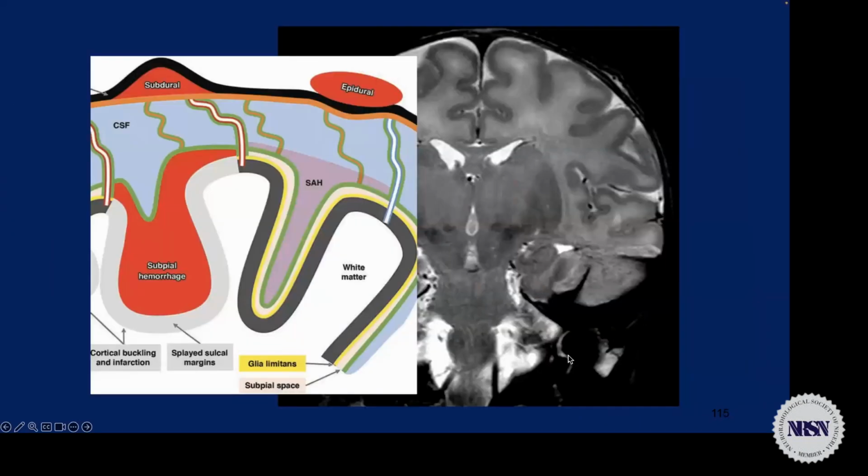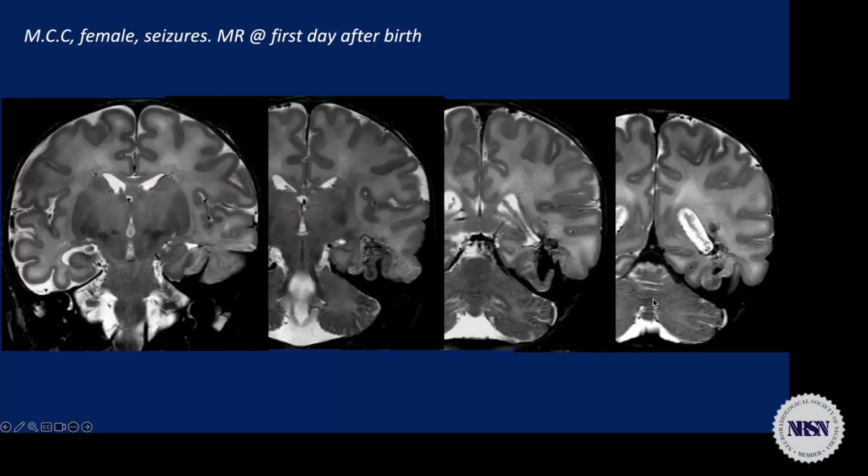And you can see here one case. This is just blood within the subpial space. And what is important is that this blood is also present together with the cortical lesion. So where there is blood, very frequently the superficial cortex, the nearby cortex, is affected, so is ischemic, and we can also have a hemorrhage in the subcortical region.